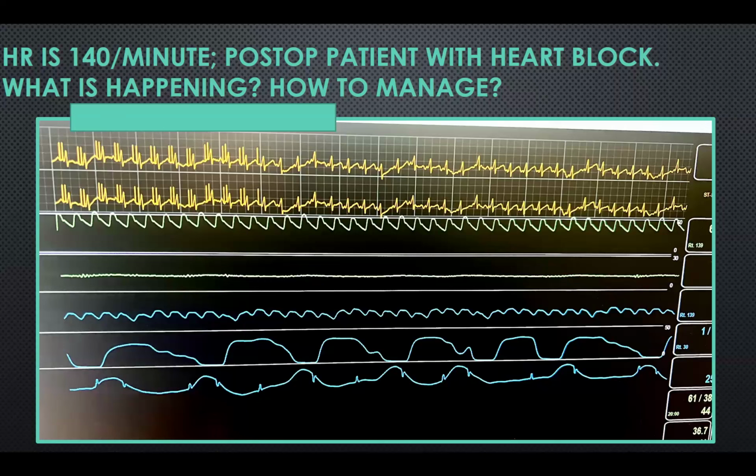Okay. Yeah, but to me, I don't see any kind of hemodynamic changes either. I think we just lose the pacing spikes. Okay, why is that? I agree with all of those statements. Yeah, I think someone may just have turned off the pacing spike option on the actual monitor, but it still looks like we're A pace, B pacing. Right.